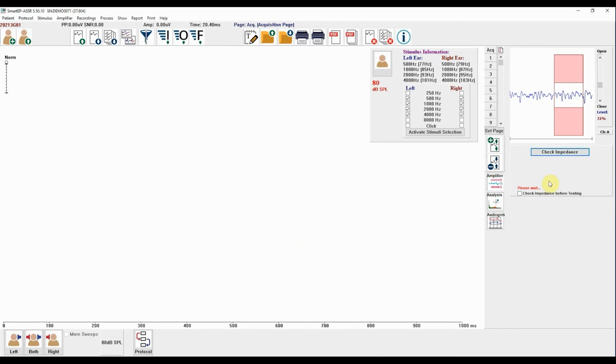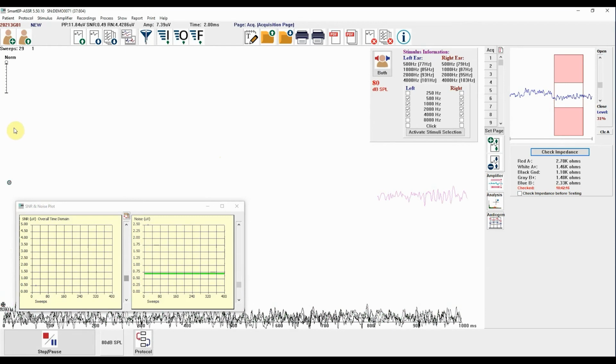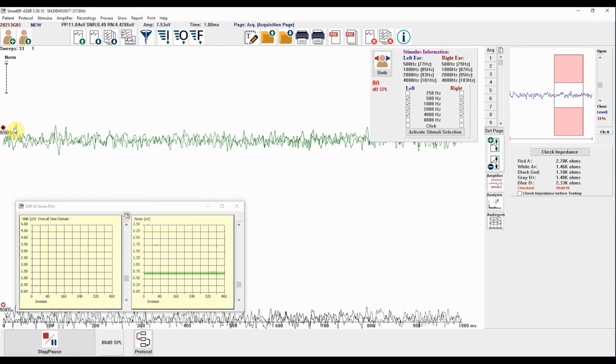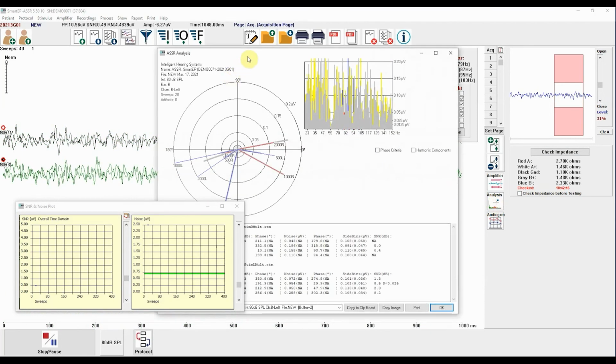I have provided testing strategies throughout this video presentation, but here's an additional list of technical tips collected from clinical field observations. These are just suggestions, and you may have your own techniques that work better. The most important component of the setup is grounding, especially for the lowest amplitude ASSR responses. Please refer to the IHS Good Quality AEP video for more details.